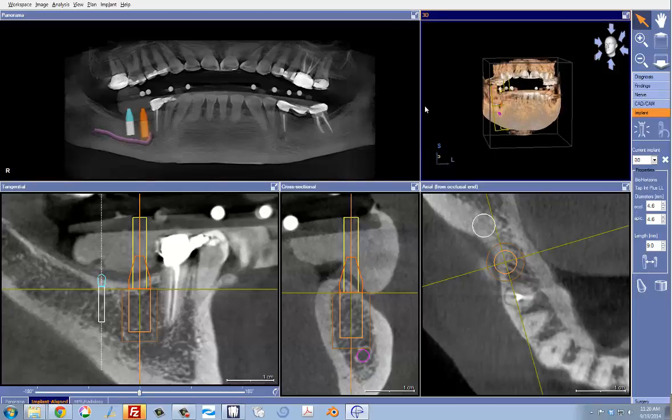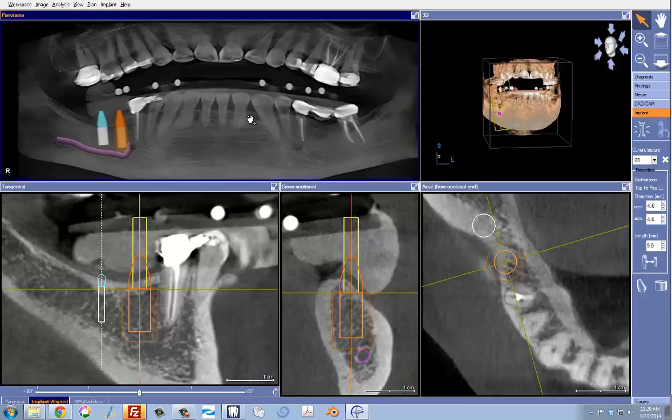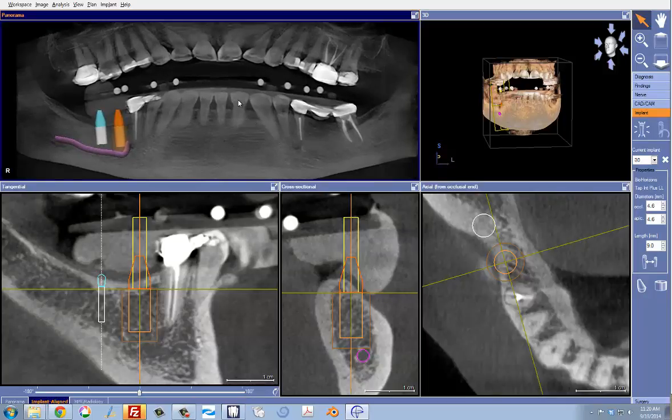My first question is, I'm not familiar if the dentist who submitted this has CEREC or not. If this is a CEREC office, my first suggestion would be that this is an ideal case for an OptiGuide, which would negate the need for the bite plate. The other, probably bigger advantage in this case would be that the CEREC data would allow us to virtually wax up tooth number 30 and 31 to plan those teeth in ideal occlusion, so that we could use the restorative plan to design the implant location ideally.